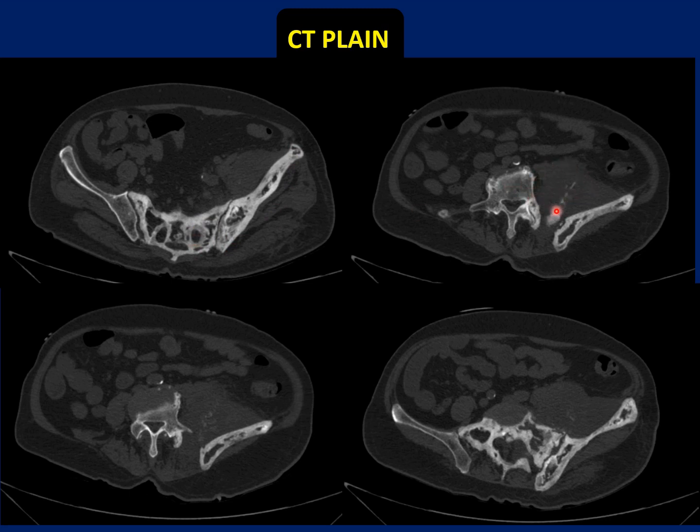And the soft tissue mass which was seen in MRI shows few areas of irregular calcific foci or matrix which is favoring a bony matrix. In the center of the mass lesion there is evidence of hyperdense calcification which is noted. The same thing which was noted in MRI is better appreciated. There is evidence of cortical destruction which is noted in the left sacral ala. Bone expansion is better appreciated here when compared to the opposite. Definitely there is bone expansion which is noted here.